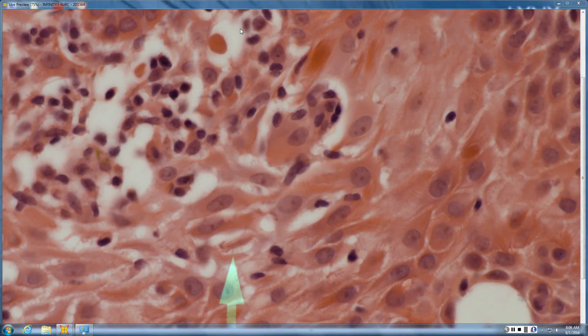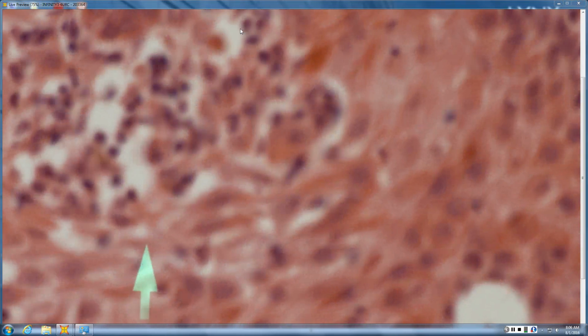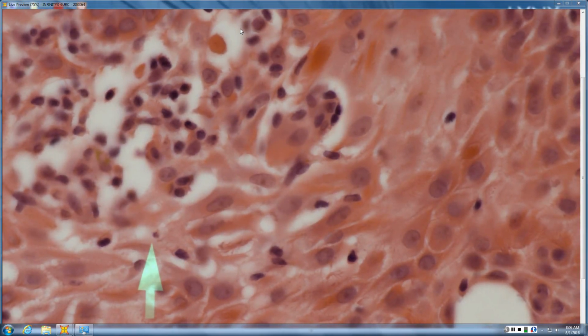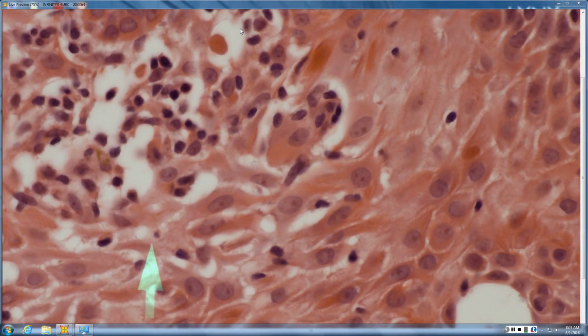So it's just a lot of sponge that's causing everything. If you see all those prickles, all those spines, those are all desmosomes hanging on for dear life. So there's no acantholysis there. There's just edema between the cells. One of the hints is the cells were spindled. It's hard to get a spindled acantholytic cell, right? They tend to round up when there's acantholysis.